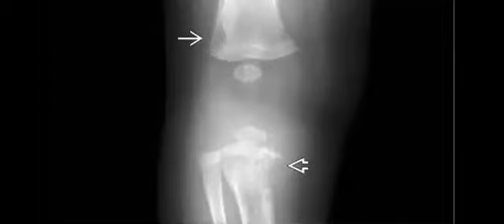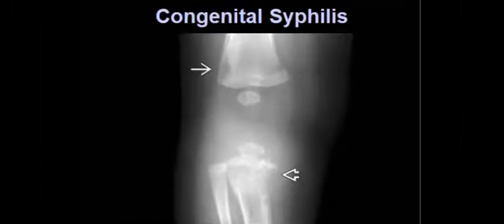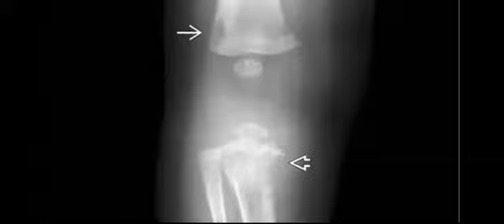And if I told you this patient has a very rare congenital disease, what is this sign called? Wimberger sign, syphilis. Yes, this is syphilis, Wimberger sign. Perfect. So this one is what's called Wimberger sign. And again, congenital syphilis could be included as a differential. Okay.